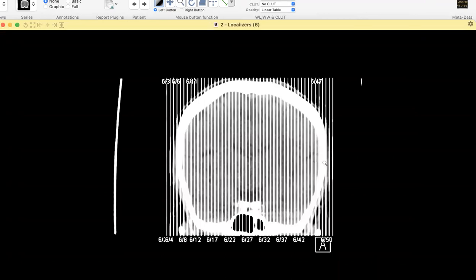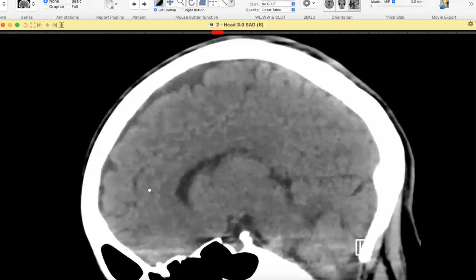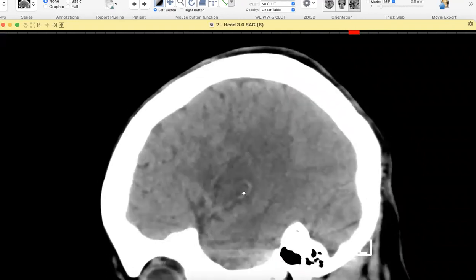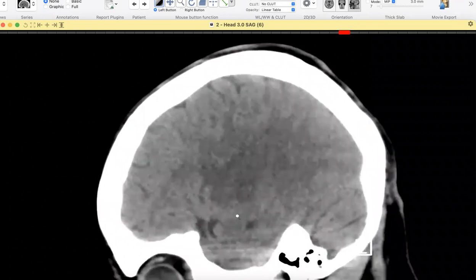I don't know why I can't get this to scroll now. So here you have these thrombosed branches. I don't know whether they can do thrombectomy for the smaller branches, unless you see a hyperdense clot within one of the bigger MCA branches. I'm not sure if you can recommend a thrombectomy, but what you can recommend is a CT angiography to confirm the clot. So before passing the case on to an interventional radiologist, my next step would be to do a CT angiography to demonstrate this thrombus properly.